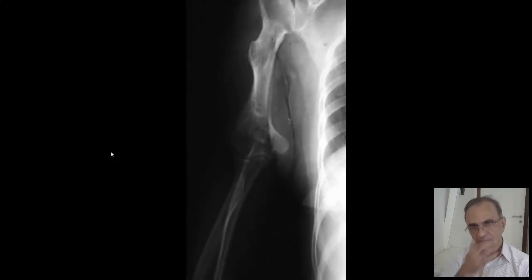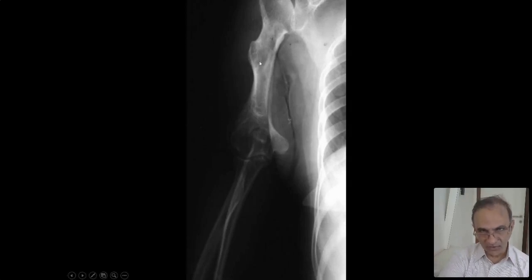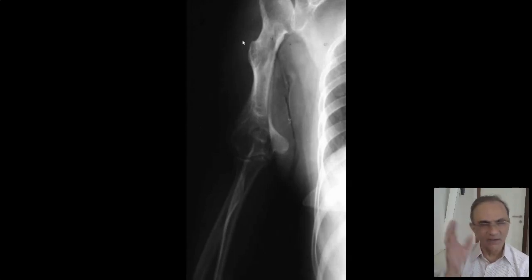Look at this. The bones are short. It's obviously abnormal. It doesn't take much knowing to say that the bones are abnormal. Anytime in the human body you see a bone coming out of bone, it is an exostosis. If it is a single exostosis, it does nothing. It comes like giraffe's horns and goes away on its own, right? It seldom becomes a malignant lesion. So that's a single osteochondroma. That's not a dysplasia. That just comes.